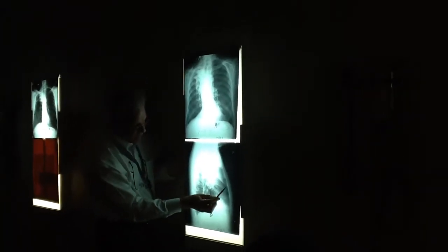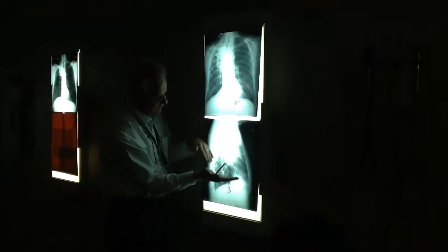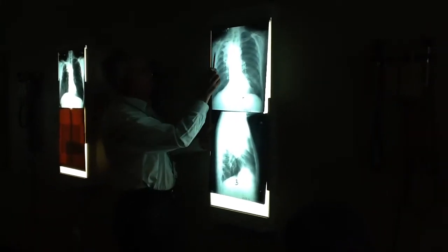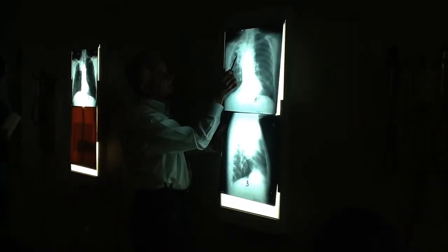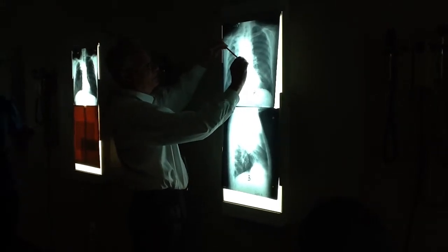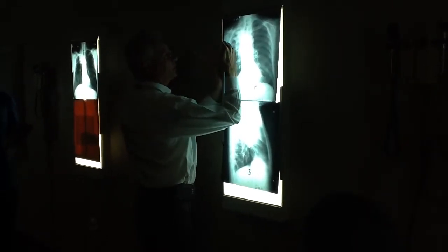We look on the lateral, you see this? Minor fissure, and part of the border right there, major. So we're getting the increase in density, because this should be back here, this should be down here, and they're going like this. But this has got a little bit of a unique configuration to it. This right here is the minor fissure. Now, do you see how it's not coming over like this, which is what we typically get with the minor fissure as it's moving up? Because it tends to go pretty uniformly as the fissure goes up like this. It tends to go like that. But what's happening is the fissure out here laterally is starting to go up like this.